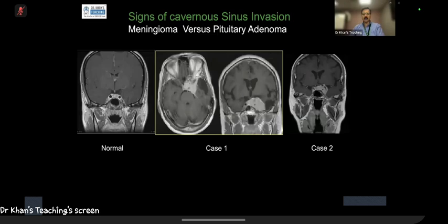What is happening here? What is here? Show me this, show me that. Where is the MCA? Where is the ICA? So these kinds of questions will be there.